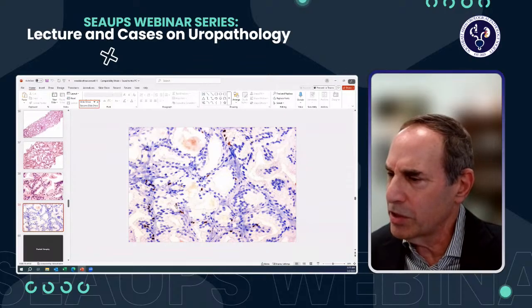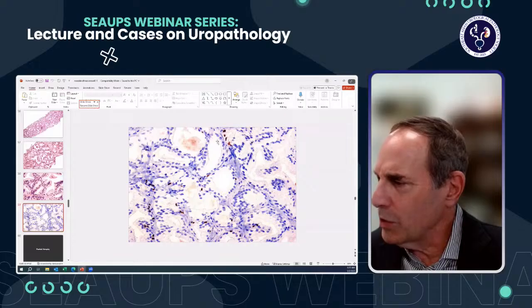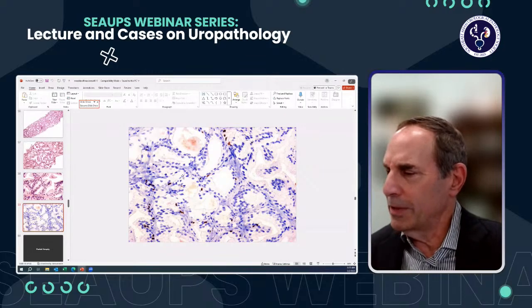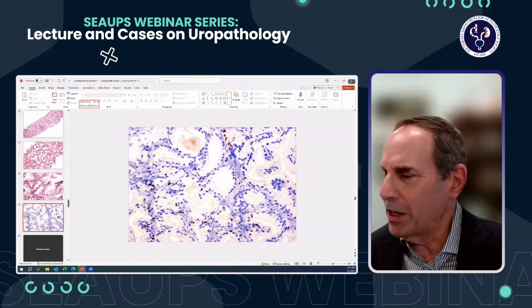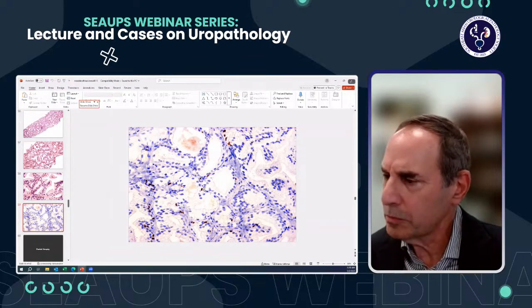Now, you have to be careful with adenosis because not every gland will show staining. Here we see several glands that are negative, and the staining that you see will often be very patchy, meaning within a given gland, you may only see 1 or 2 cells that are positive. So consequently, you have to be very careful calling cancer in the setting of very benign cytology, because it could be adenosis. And even if there's just 1 or 2 cells that are patchy, you want to back off and not call it cancer because that still could be adenosis.